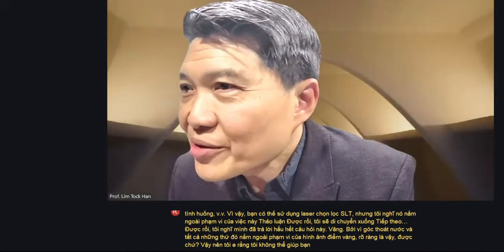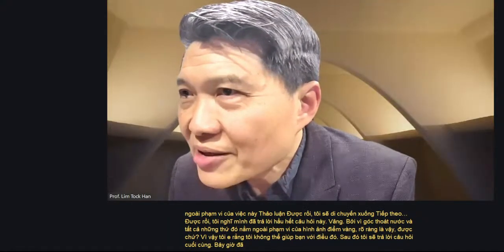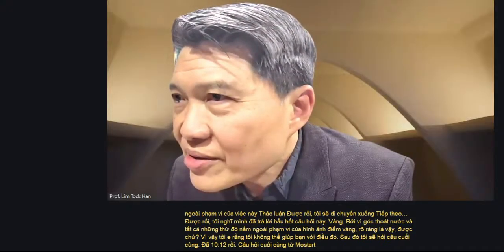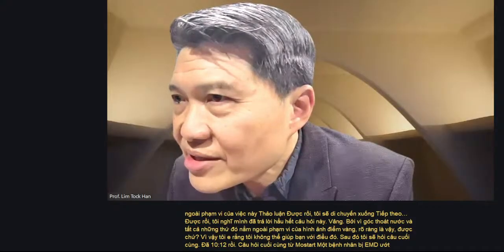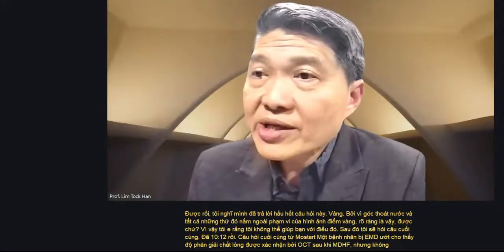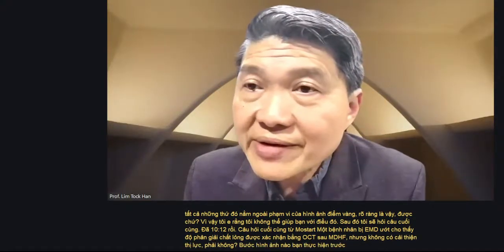Then I'll probably go for the last question. It's already 10:12. The last question is from Mr. Mohammed Mostak. A patient with wet AMD showed OCT confirmed fluid resolution after anti-VEGF, but no visual improvement. What imaging step must you take before labeling this treatment failure?